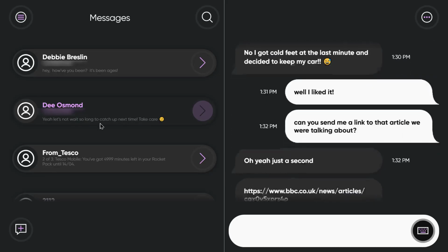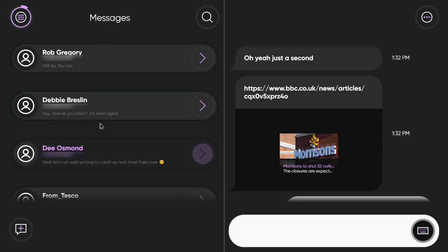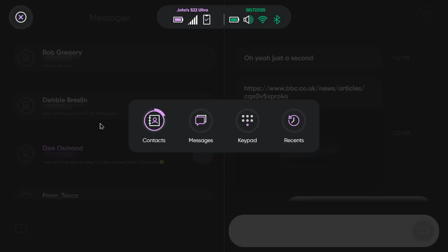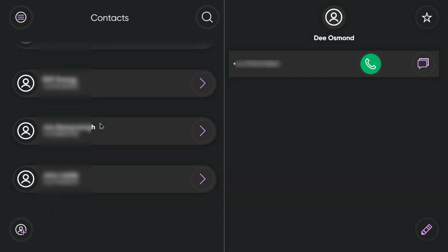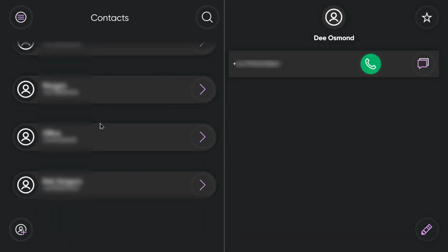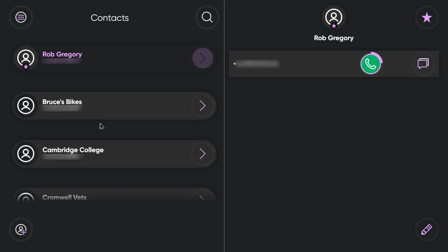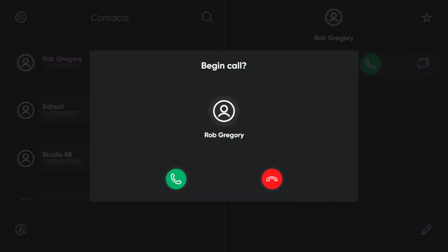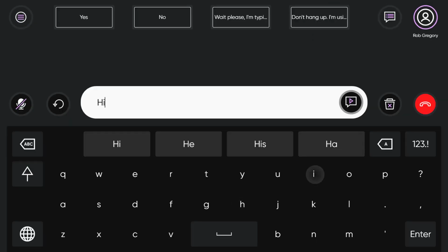With TD Phone, we strive to provide a natural and intuitive interface to telephony tools for eye tracker users. For example, scrolling through your messages or contacts with your eye tracker is a breeze. Simply look towards the top or bottom of the list. And it is really easy to prioritize your favorite contacts. The audio from your conversations goes straight down the phone line, meaning that the sound quality is perfect and there's no relying on the speakerphone mode of your handset.